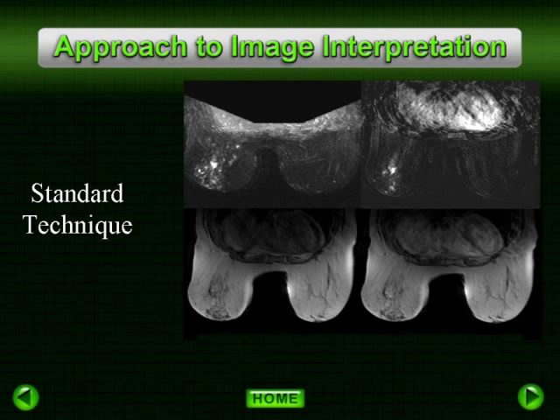As we have no fat saturated image, we do still evaluate the raw data with pre- and post-contrast images viewed simultaneously, along with the individual 1-minute subtraction image.